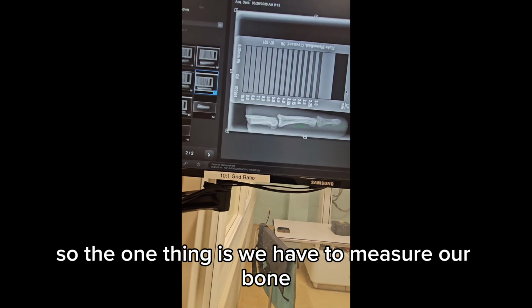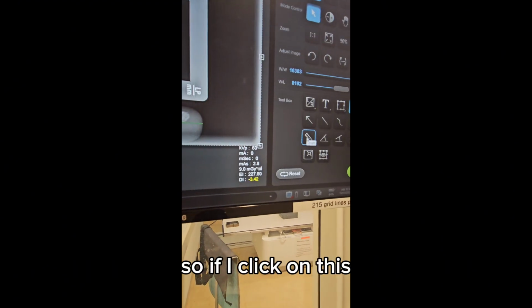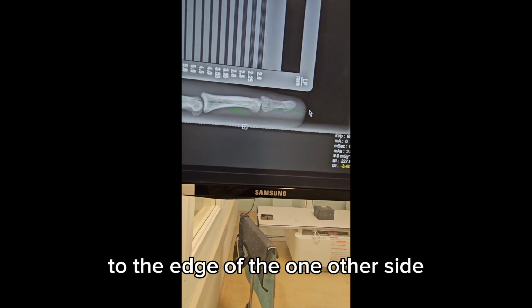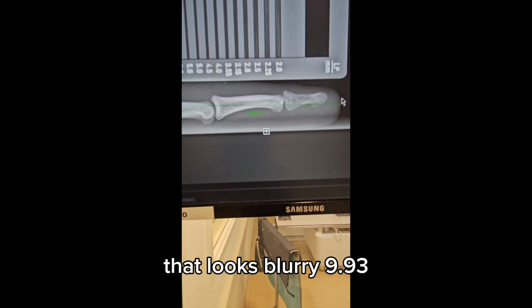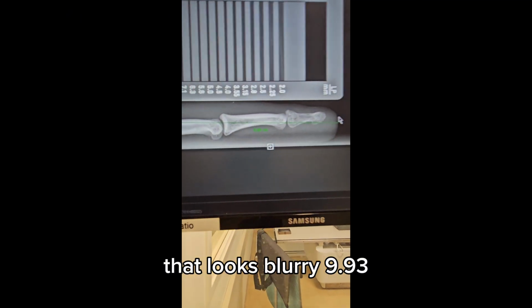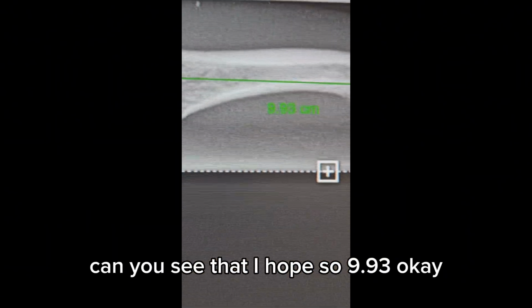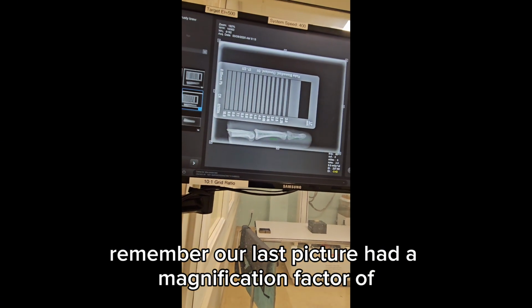So the one thing is we have to measure our bone. You can see that they already did this here. So if I click on this and measure from the edge of one bone to the edge of the other side, our measurement is now, oh, that looks blurry, 9.93. Can you see that? I hope so. 9.93.